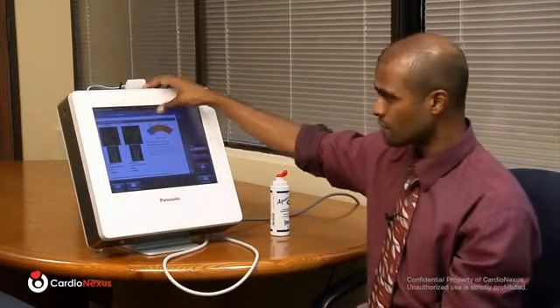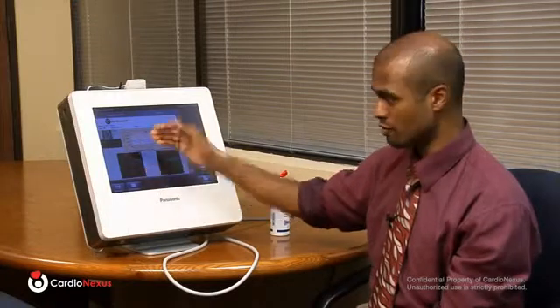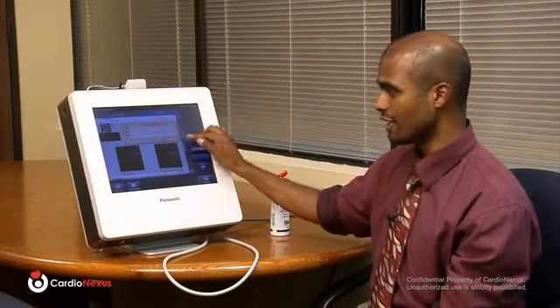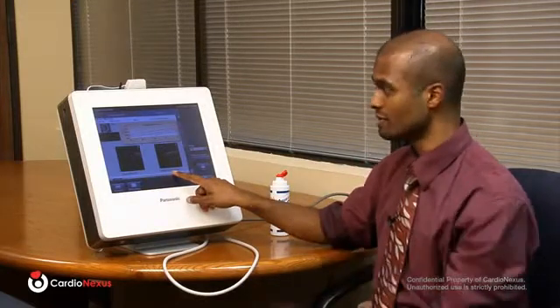The second page of the report, if I choose carotid here, will contain any and all images that were captured. So you'll have the plaque image here, transverse view. You'll have the IMT measurement, the automated IMT measurement on the longitudinal view. And again, you can see the plaque assessment as being absent, and the IMT measurement, again, automated IMT measurement, in this case is being 0.47.